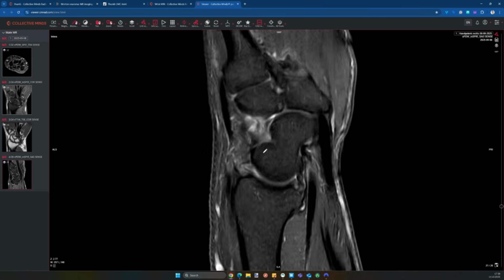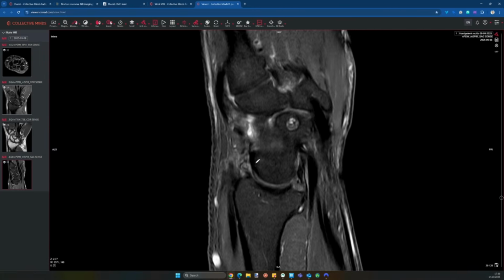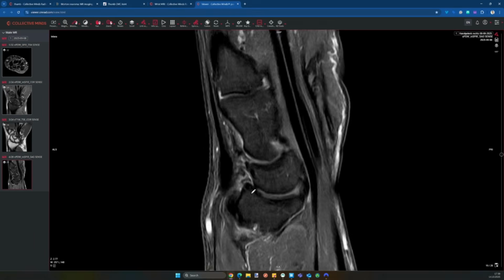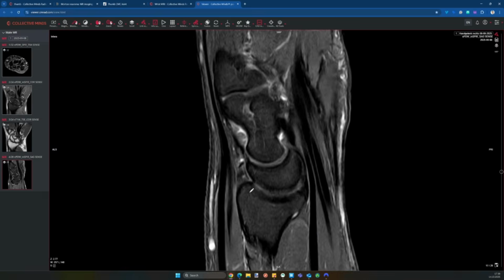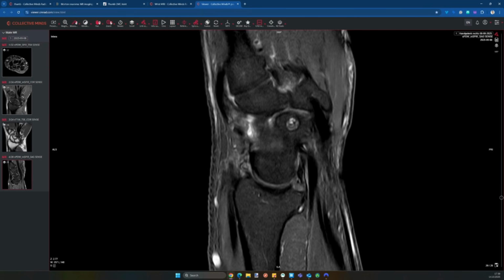Let's go for the extrinsic ligaments here. Dorsal intercarpal ligament is fine. Maybe some degeneration of the dorsal radiocarpal ligament, which is a bit ill-defined. The volar extrinsic ligaments are fine. So I think that would be the assessment here from my side.